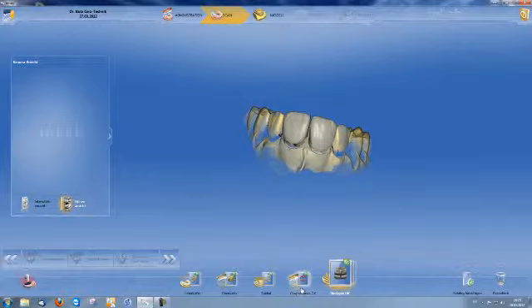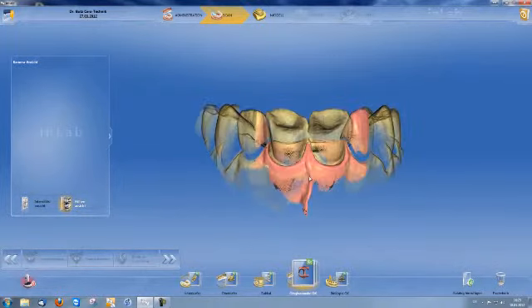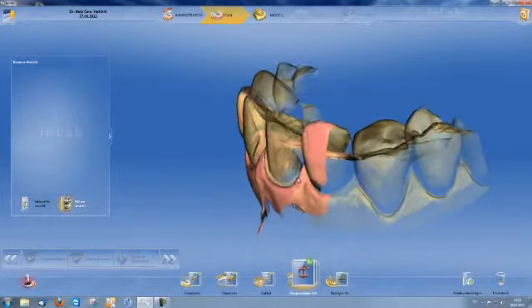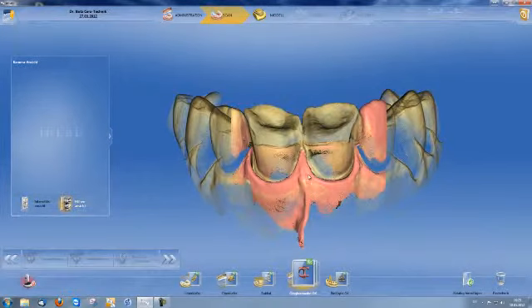and also added a fifth scan with the upper jaw gingival mask by scanning my gingival mask prior to sawing of the model. This allows me to design my emergence profile properly at a later date. Once the scans are complete, I go to model mode.